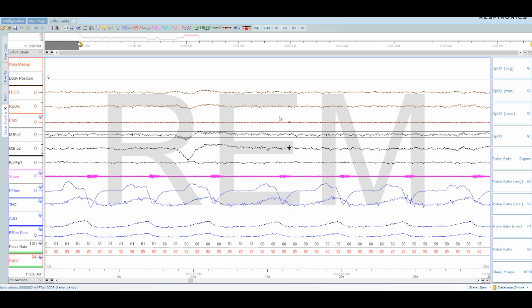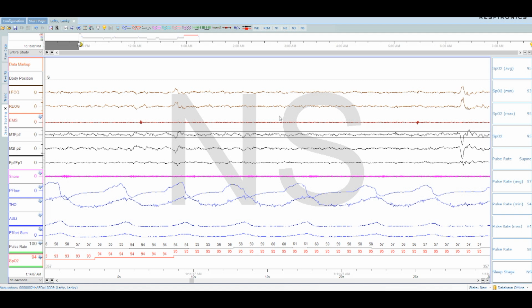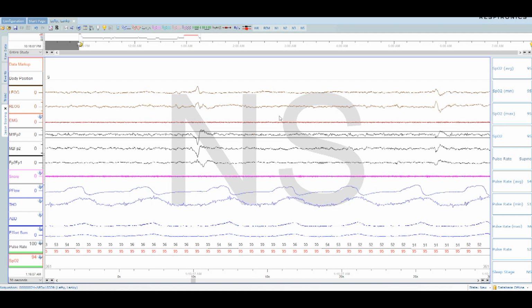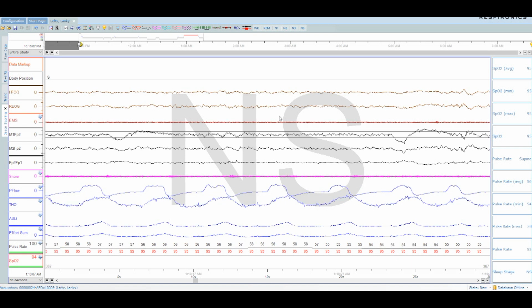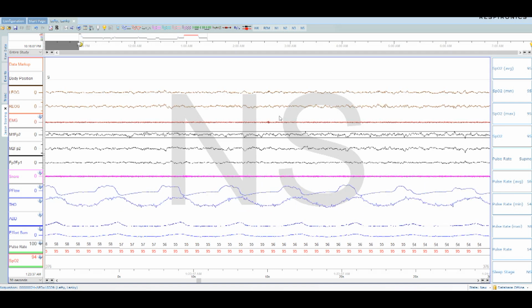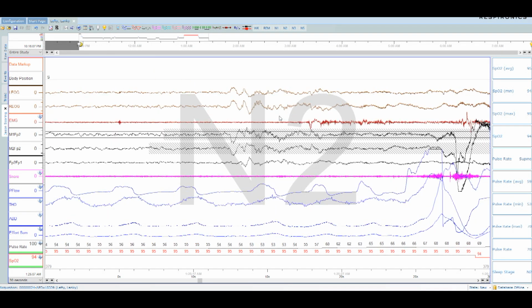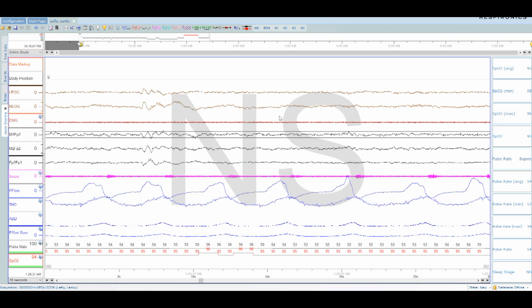All right. REM, there's an arousal there. I'm going to call it stage 1 because I'm trying to just move this along. I know I'm asleep. And ultimately with this, I care about the AHI. I don't think one epoch, if I'm off, is going to mess with the overall data set. I'm going to be just as cavalier with the next one. So we're back to stage 1.